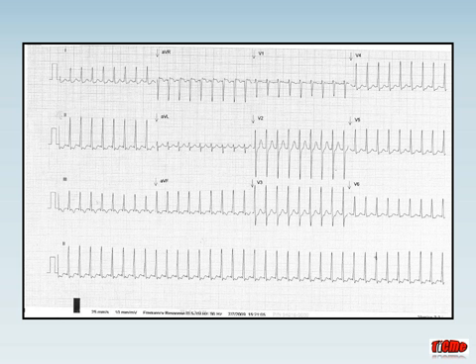I'm going to talk about how we can subclassify what you know as SVT into its actual causes by being a bit clever with the little P waves that we can have a look for. Now, if we have a look up in V1, you see that there's an R wave followed by an S wave and then another little blip, second R wave known as the R prime wave. If we look down in lead 3, there's a small Q wave followed by an R wave and then another little blip which looks a bit like a small S wave.